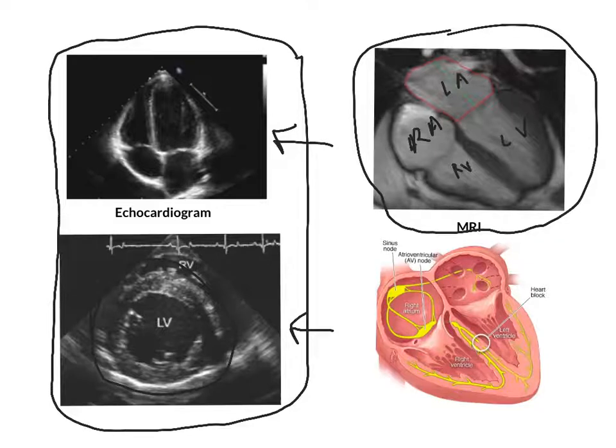Now, years ago, even before I started doing echocardiograms, probably in the 1970s or 80s, early 80s, 70s most likely, some doctor decided when they got 2D imaging into the picture where they could look at the heart in live shots, like this particular picture here, that it was easier for them to look at this picture in this plane and also in this view, where the atriums are on the bottom.